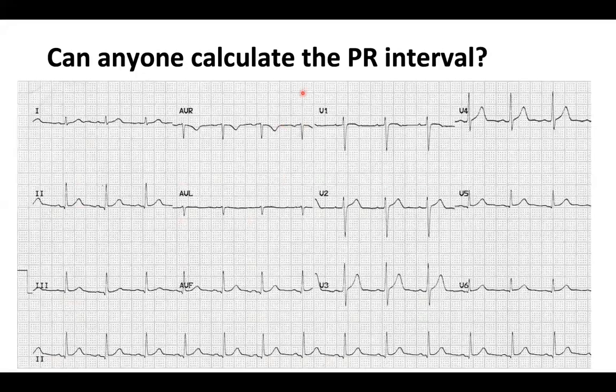Okay, can anyone tell me the PR interval here? We've got no takers just yet, so it's really difficult to see this, unfortunately.